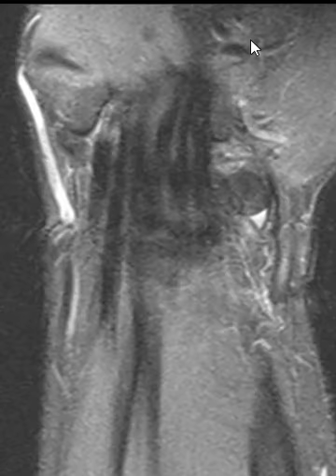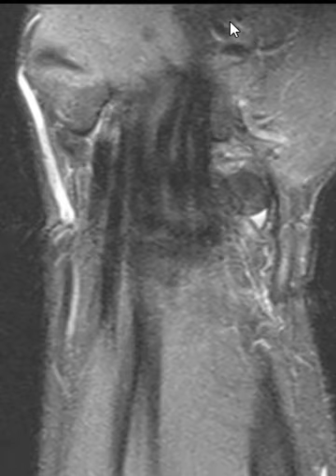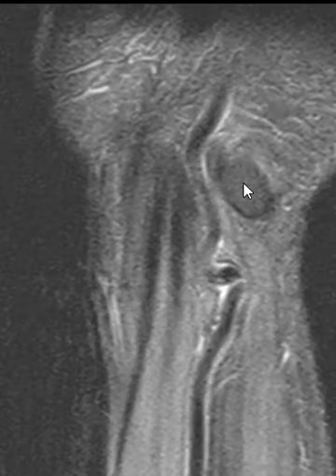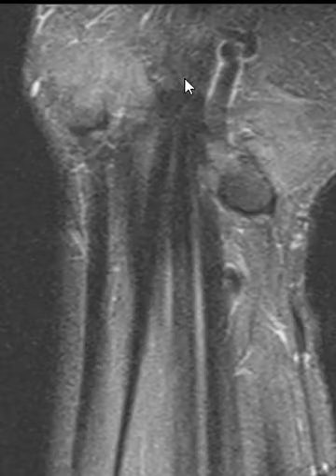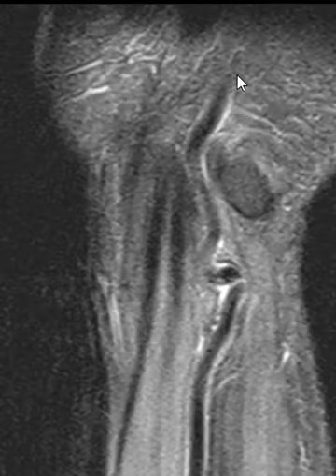Now here distally we see that the distal ulnar artery is also ectatic and has some tortuosity, and some of the distal vessels are also prominent. And I don't see a palmar arch going across here, so he may have hypothenar hammer syndrome, where instead of being compressed here by the pisiform bone in Guyon's canal or by the hook of the hamate bone, he may have had a prior occlusion there in the palmar arch possibly. And so he may need a vascular study, a CTA or angiogram to look at that.